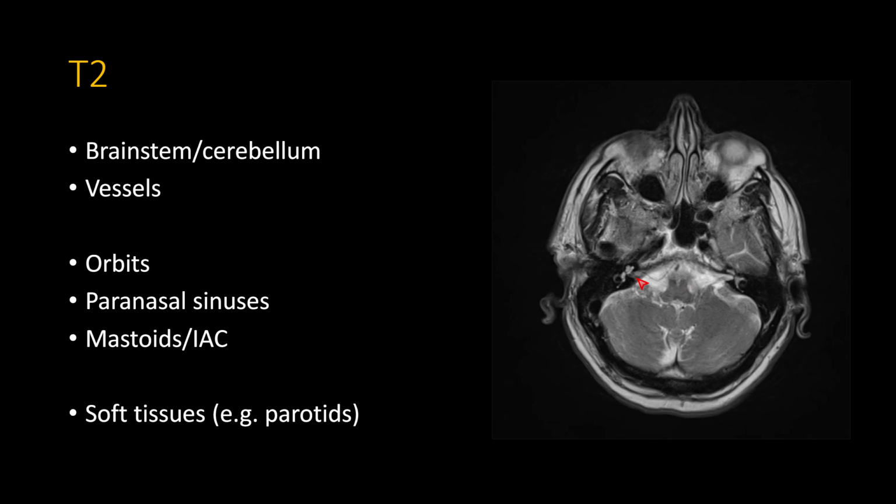While you're looking at the mastoids, I typically look at the internal auditory canals. Make sure you see nice CSF within them, as well as the labyrinthine structure. So your cochlea, vestibule, you can see here your semicircular canals. Just make sure there's preserved T2 signal within those.